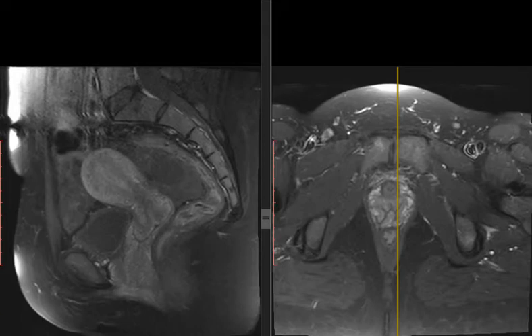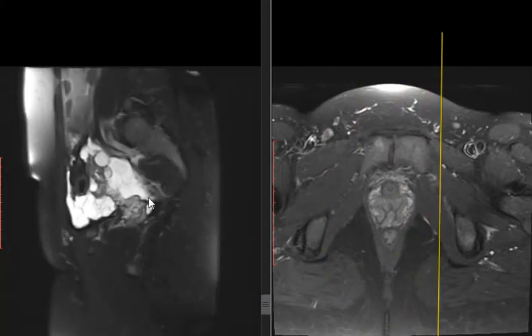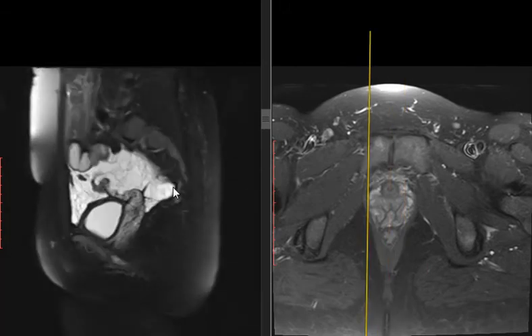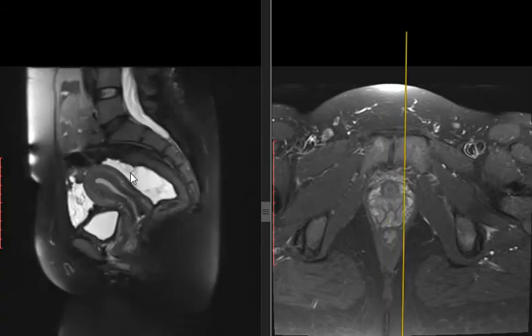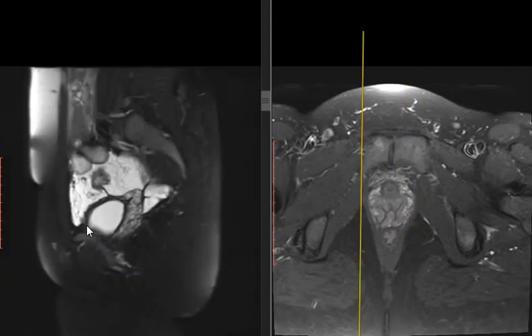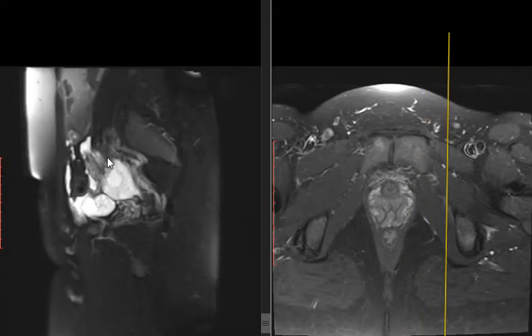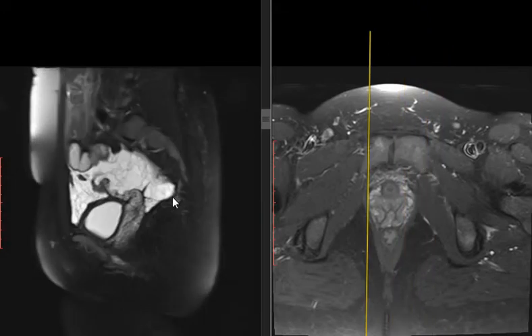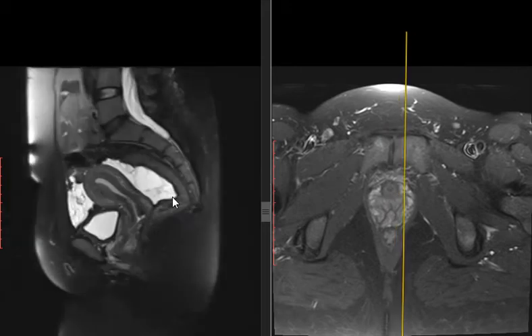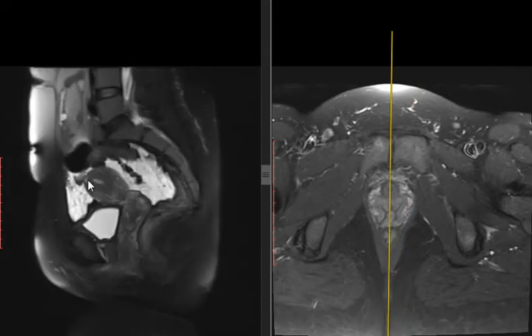Can you determine the origin? That's from the wall of the abdomen. If you find it behind more than one space, retro-uterus, I think lymphatic malformation. It's one of the top differential diagnoses. Okay. Does she have any previous history of surgery? No. The only surgery that she did was to remove this mass and have the histopathology result.